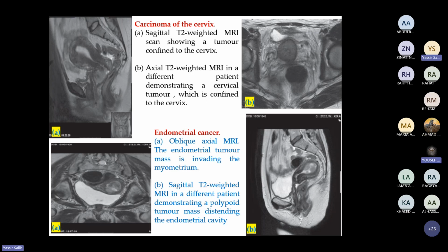Sagittal MRI. MRI. Okay, what is this? Spine. This is a spine. And what is this? Uterus, endometrium. Yes. And what is this? Rectum. The rectum. Yes. What abnormality do you see? Enlarged, enlarged what? Endometrium. Cervix, tumor in the cervix, and obstruction.